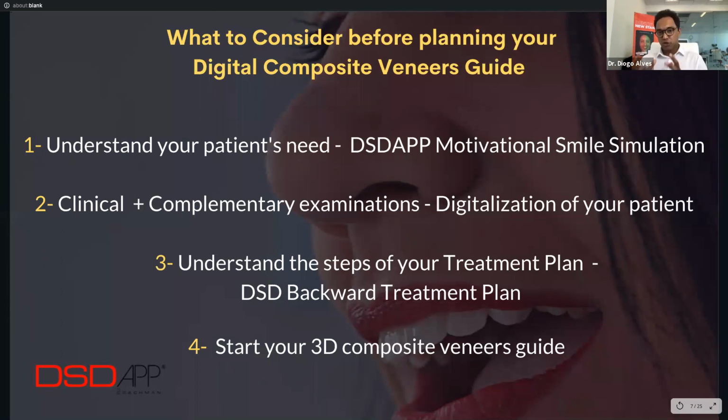So once you have this digital patient on your iPad or on your iPhone, you'll be able to design, you'll be able to discuss the treatment with your colleagues anywhere you want. And this is part of the step 3. It's understanding the steps of your treatment plan. This is what we call the DSDApp backward treatment plan.